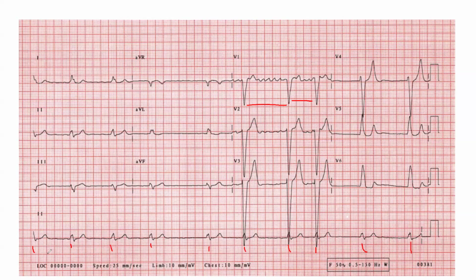Okay. Is there any P wave? I think so. Where? You can use your cursor. Do you have a mouse? Yeah. Okay, I don't think there's any. I can give you the remote control. Yes, okay, now it's yours.